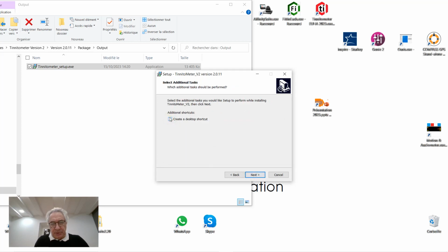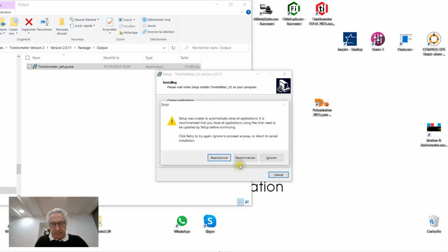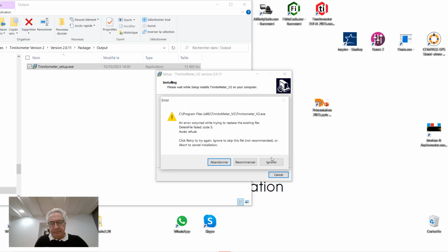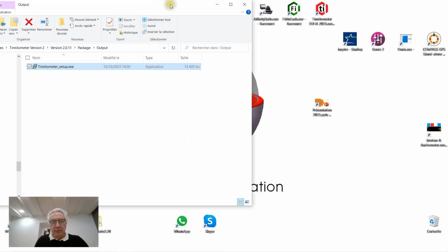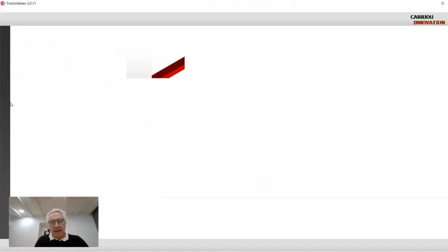Create a desktop shortcut. Next. Install. Next. I have to ignore because I already have an install before. Don't worry about that. Here we are. So we did finish this install and we can begin.